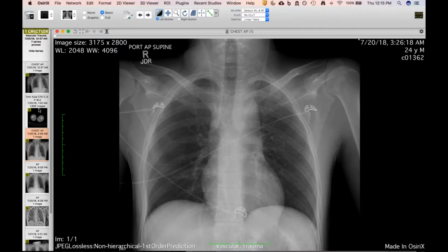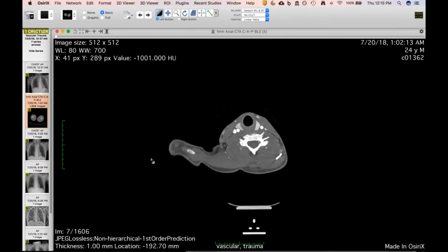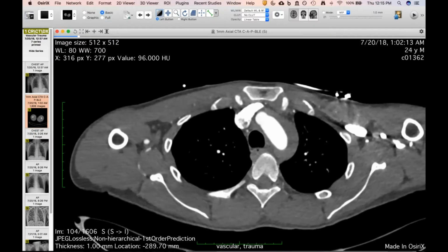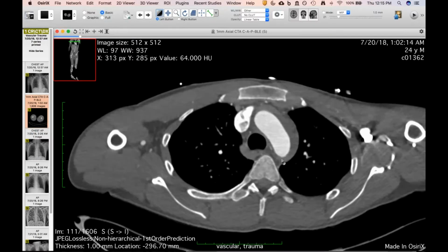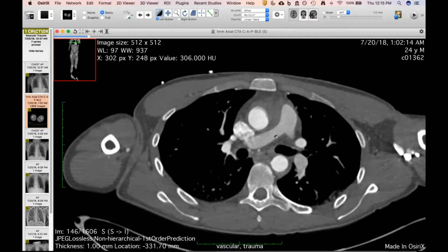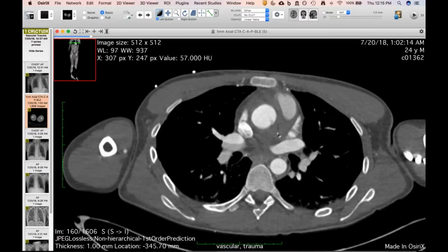And he had a CT done, and this was just the trauma pan scan. And we do in fact see that he has a mediastinal hematoma. But what's interesting about this is the location of the aortic injury. And the aortic injury is right here. So it's above the sinotubular junction a few centimeters, and it's in the ascending aorta, which I remember Seth showing the case at the root.